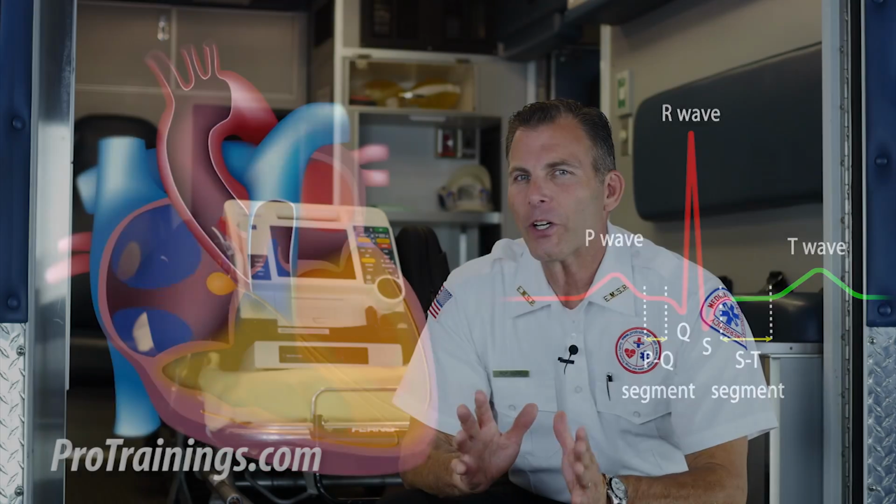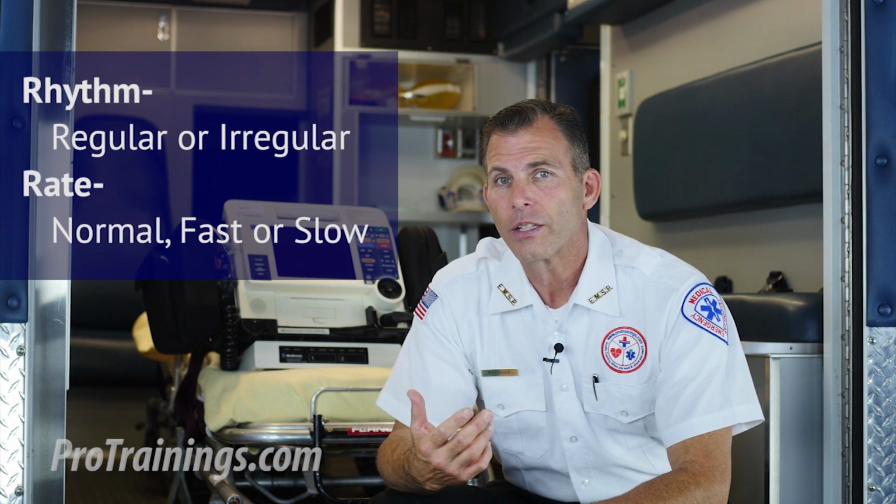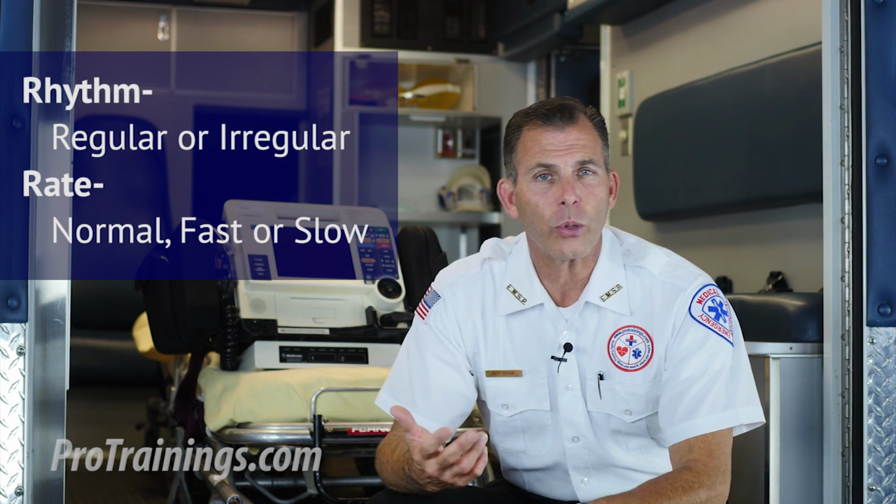I believe that it's very helpful to healthcare professionals to have a repeatable and easy way to interpret ECG rhythms, and therefore we're going to follow a serial pattern for reading and interpreting all ECGs. The pattern of interpretation most commonly used is to look at the following. The rhythm. Is the rhythm regular or irregular? Next, the rate. What is the rate? Is the rate normal, fast, or slow?